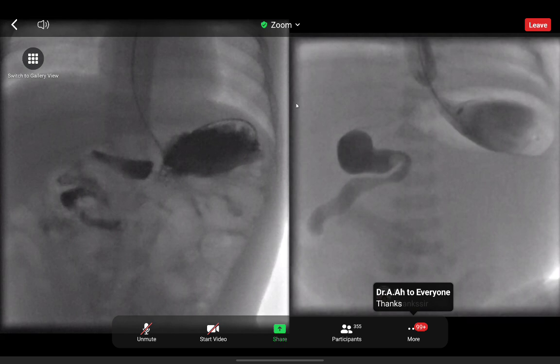FRCR style pediatric cases. And I always start with this one because it's one of the most important pathologies that you cannot miss in children. So this is two different children with the same pathology. They're both 2 days old, and they have bilious vomiting. And yes, so midgut volvulus is the right answer.